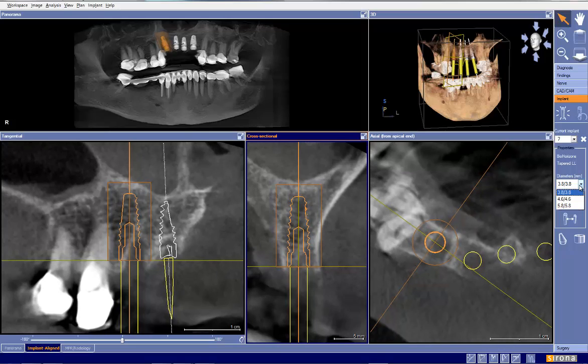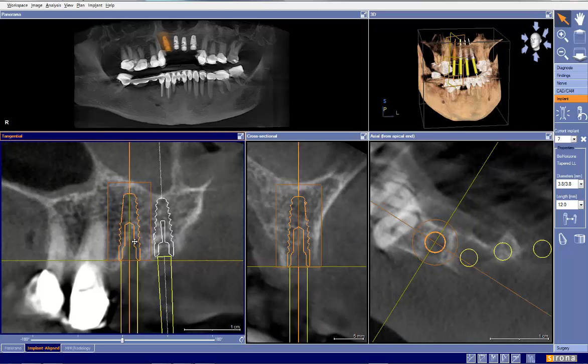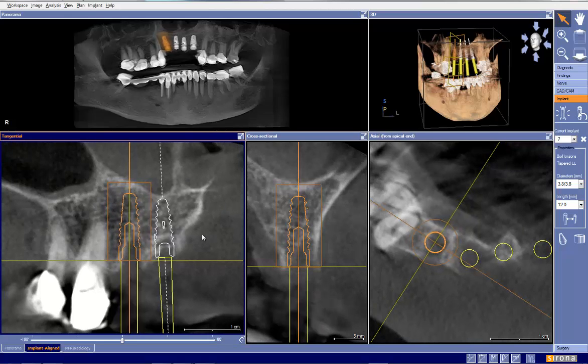I would guess that this implant should work here. I would maybe consider the 3.0 implant in this particular site. It's perfectly and ideally made for lateral incisors. However, it's still questionable whether that would give us enough space to place 4 implants here. Okay. So hopefully that makes sense.